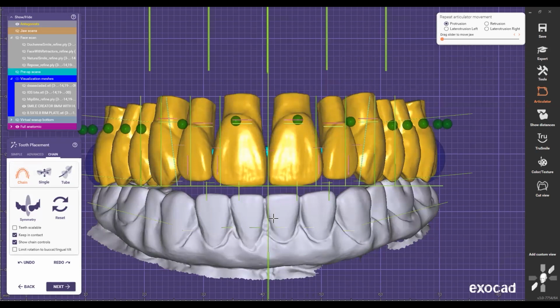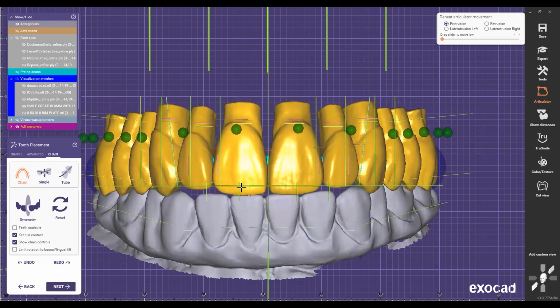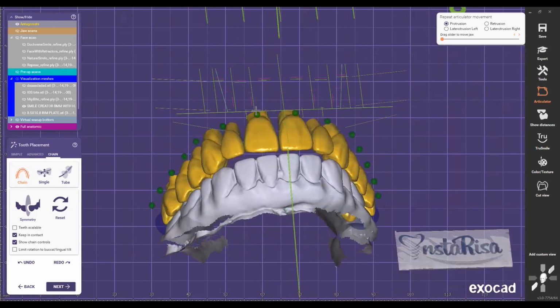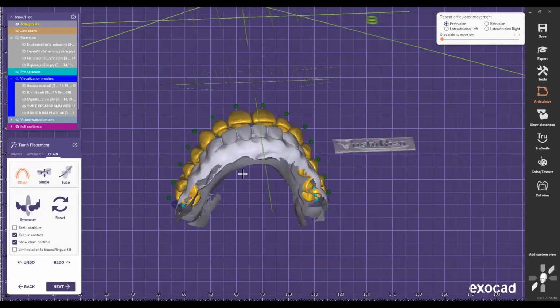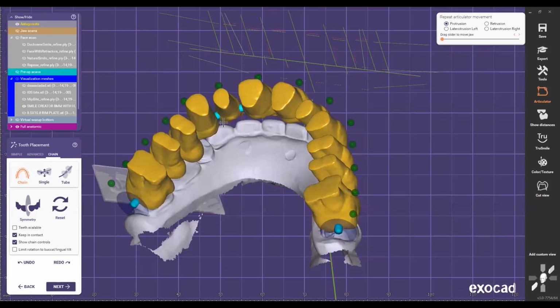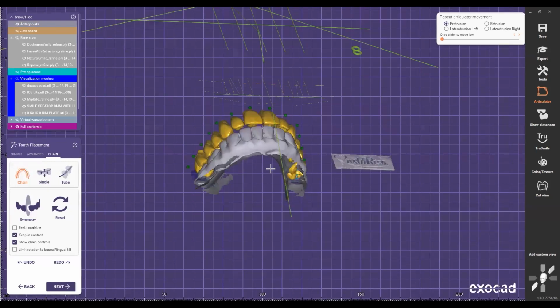Or the other option is, I can just bring everything right here down, kind of like edge to edge. And I tell the patient, okay, you're still gonna have a space right there, but we're gonna fix it once we do the lower. Because this lower seems like it could be acrylic with denture teeth. It's not a final, because you can see that everything is worked down right there. So that means that we still have a chance to fix these things, right?